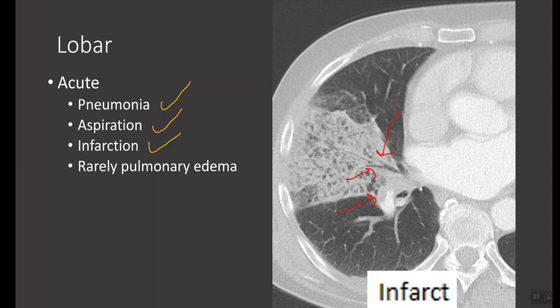In addition, pulmonary edema is not going to be one of the first things that we think about when we see an area of lobar consolidation. There are one or two specific scenarios where we could raise the possibility of pulmonary edema producing lobar consolidation. The first being after a myocardial infarction that leads to mitral regurgitation. When you develop severe acute mitral regurgitation, it causes a jet stream of blood that results in opacification located within the right upper lobe.